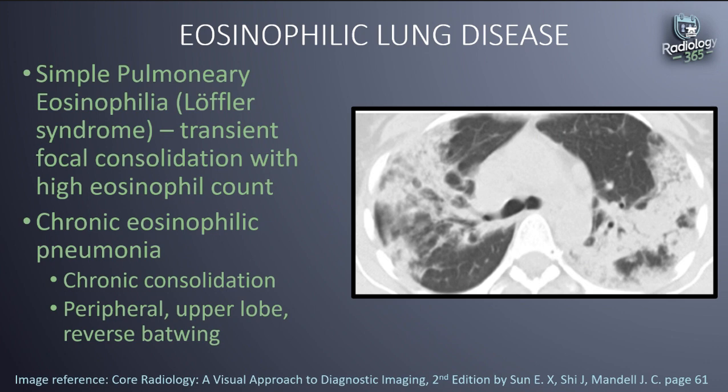So in pulmonary edema, we mentioned the bat wing configuration where you have more centrally located consolidation. However, in this case, it's reversed. So it's rather the periphery that are consolidated, and then the central part may be normal or less consolidated. Furthermore, consolidation may cross fissures, and that helps differentiate it from cryptogenic organizing pneumonia.